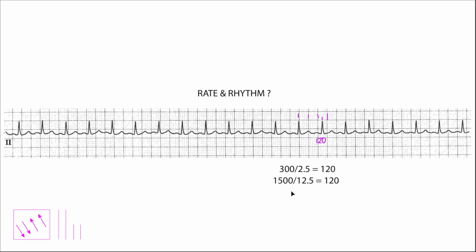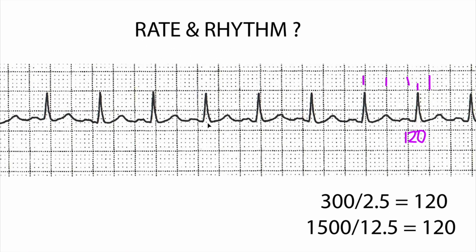Okay, enough advertising. All right, so we got the rate. The rate is 120. That is the ventricular rate. The atrial rate seems to be in line with the ventricular rate.